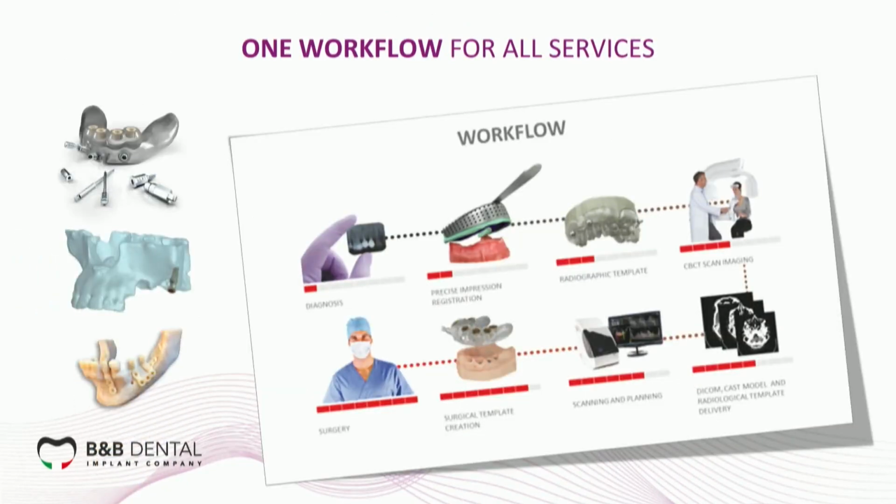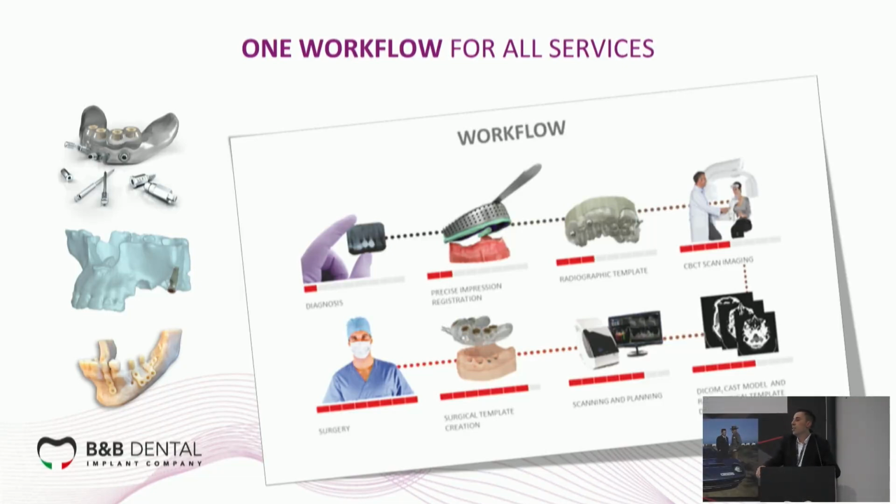One workflow for all the services. The doctor doesn't need to remember a different workflow, just one workflow. This is the workflow that we have seen before for the guided surgery.